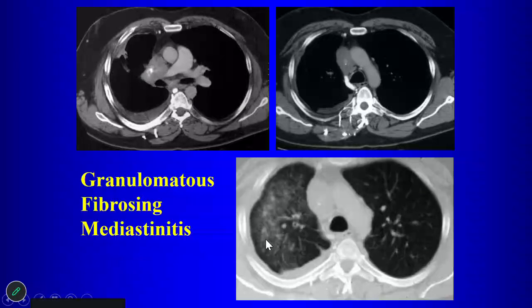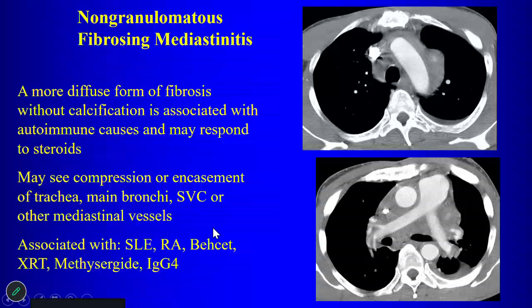So what's causing that? Ground glass opacity in the right lung with right pleural effusion in this patient. Why is that happening? Pulmonary venous obstruction on the right side. So this is asymmetric pulmonary edema. And you can see that also with fibrosing mediastinitis.